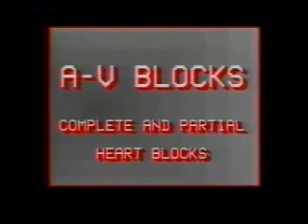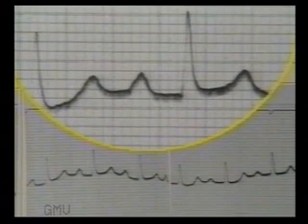AV block, complete and partial heart blocks. First degree AV block or first degree partial heart block is a block in the AV node. In this ECG, measure the PR interval. It is 6 small squares or 0.24 seconds. Normal range for the PR interval is 3 to 5 small squares. So this ECG shows prolonged PR interval indicating delayed conduction from atria to ventricles.